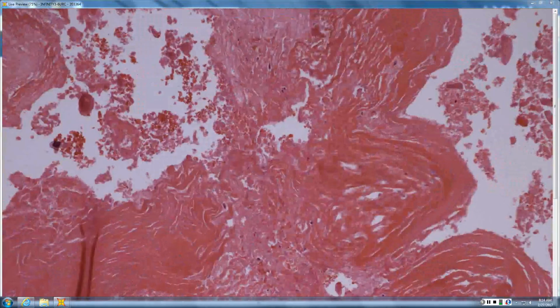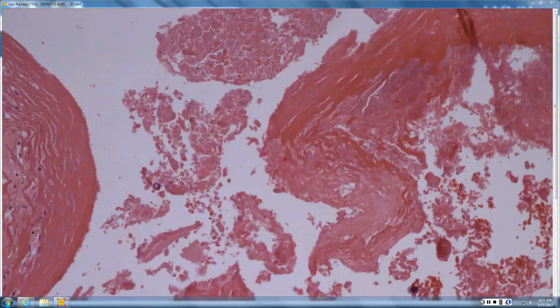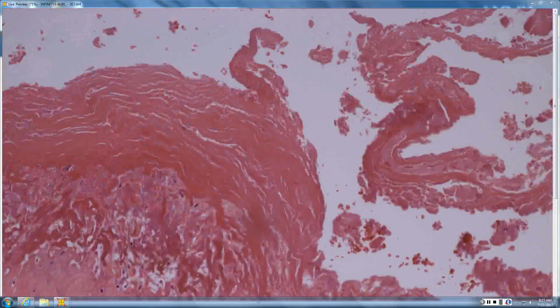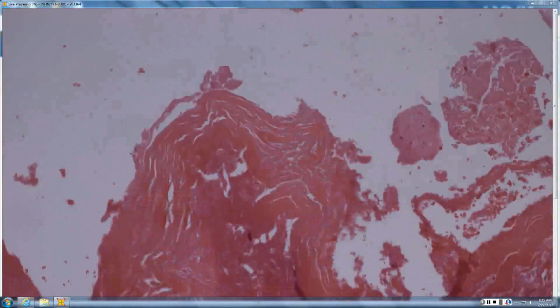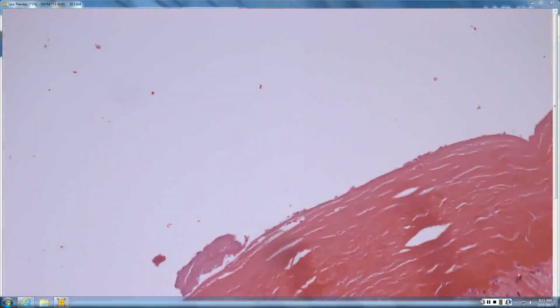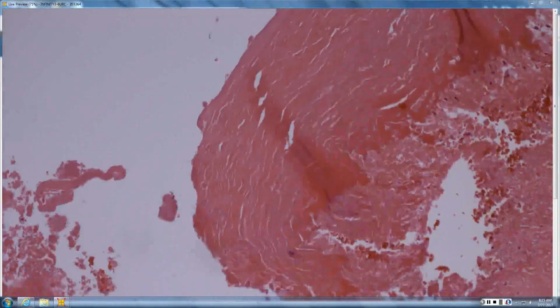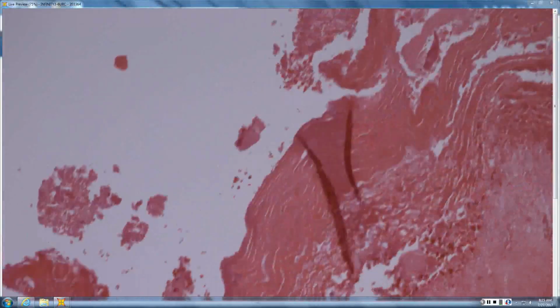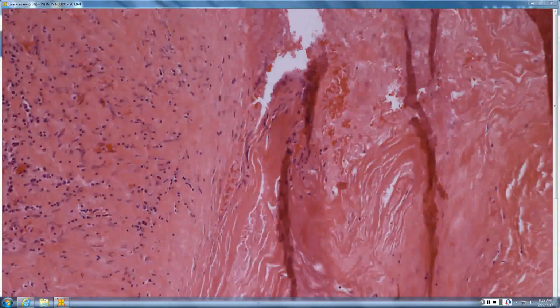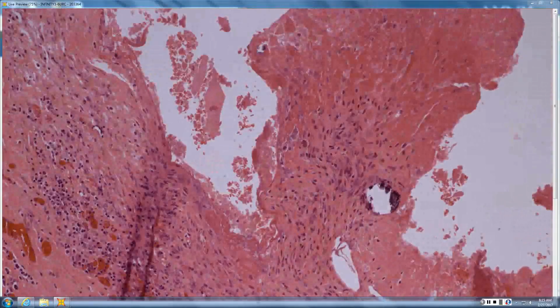This is something you could see in skin. This particular one happens to be hanging out in the liver. I don't want to waste too much time on it, but let's see. You usually get a big "oh wow" when we find it.